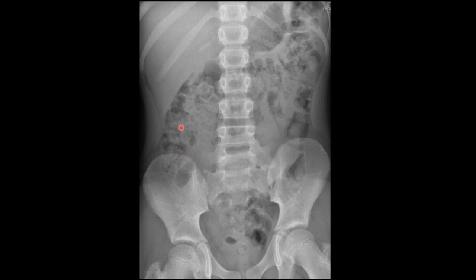The small bowel wouldn't contain fecal residue. It's fluid filled. It has a tight radius of curvature, and it doesn't have those thick folds. In the jejunum, it has the thin folds called valvulae conniventes. In the ileum, it doesn't have any folds. As we look up here, we can see there's quite marked fecal residue all the way down, and some here within the rectum. So I would say there's moderate fecal loading of the bowel there. Does that tell us that this patient's constipated? No, not necessarily. It can be normal for the patient to have a reasonable amount of fecal residue there.